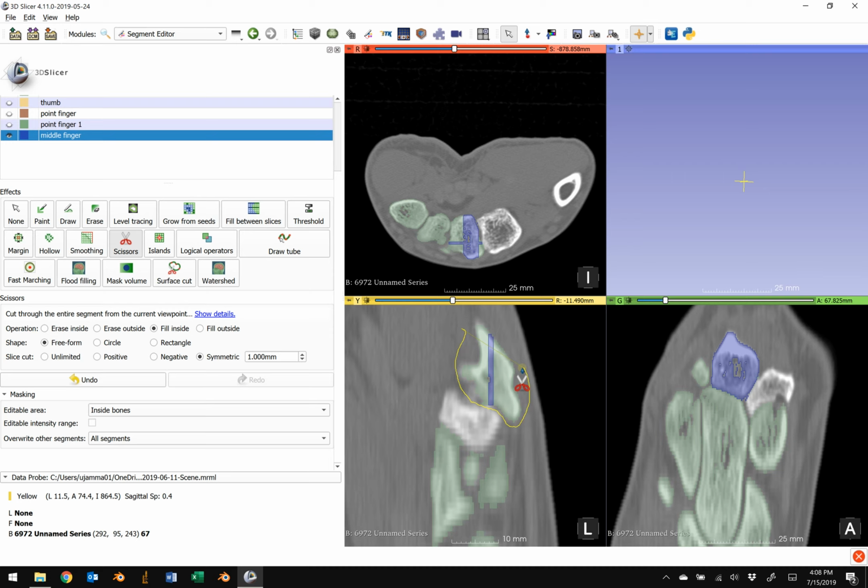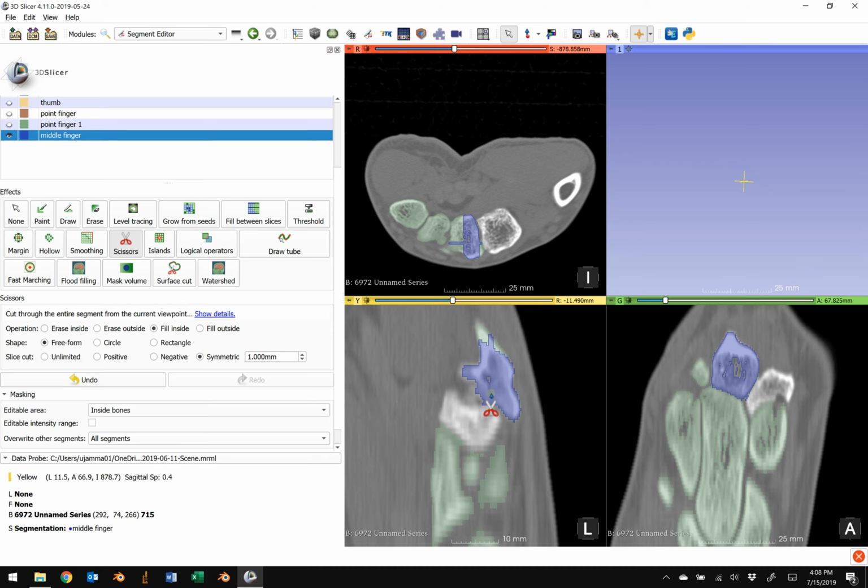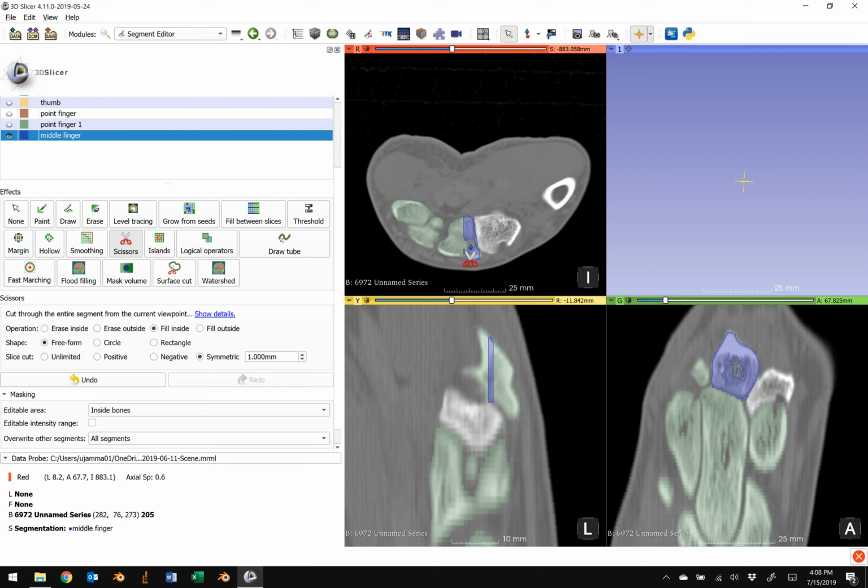You need to look at the 3 different slices, because if you look at this particular slice, I don't think it's going to be easy. So it's kind of going into this particular region too. So yeah.